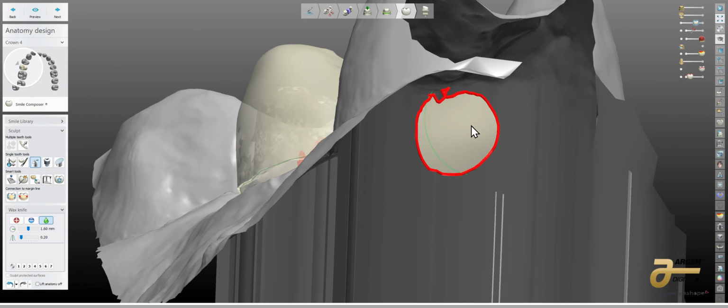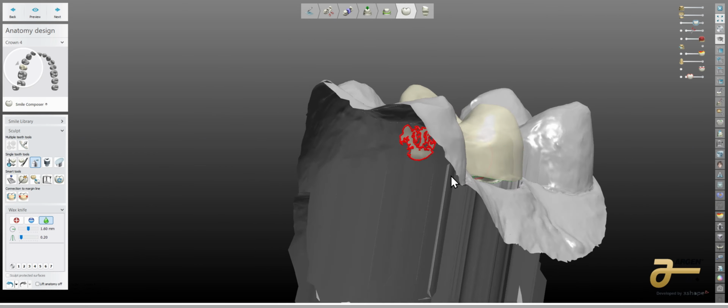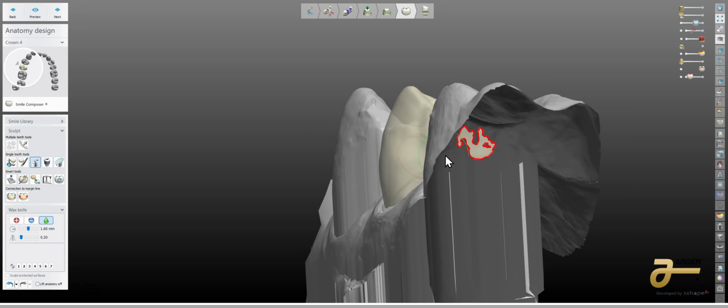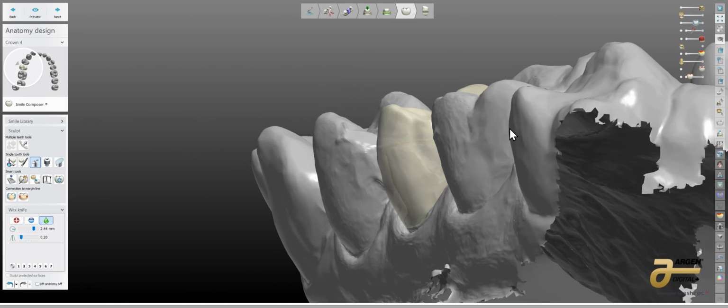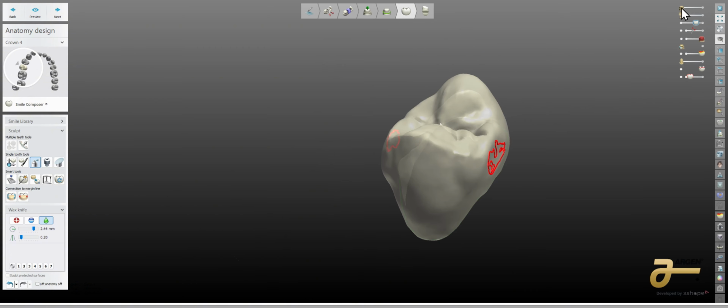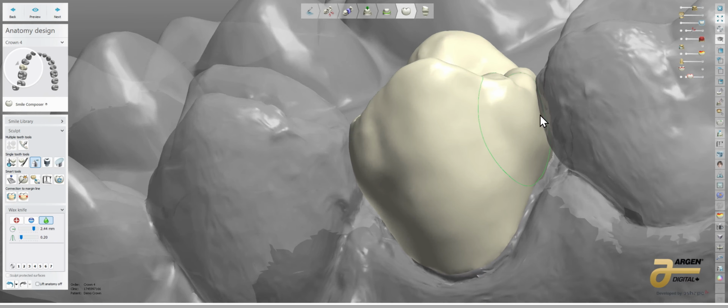We're going to smooth this out. And if you want to reduce it, you can just ever so slightly in these areas here. Same with this side. And now let's get it to any other preset that doesn't have this. Let's remove this and get rid of those contact points. Okay, so now we don't want to have concavities.